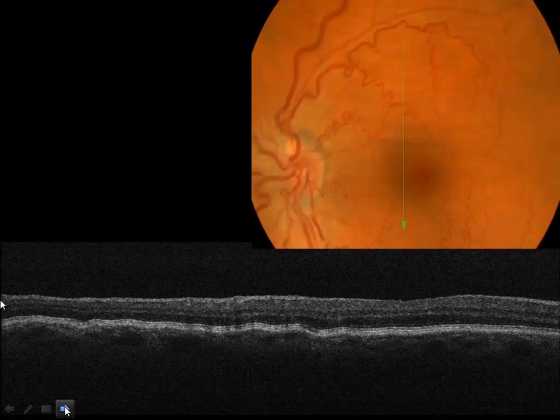And choroidal folds are problematic because choroidal folds may be due to a mass in the orbit that's compressing the globe, causing the choroid to be set into folds. Here's the left eye of the same patient. This patient actually has congenital disc anomaly with disc drusen in addition. And these are just very interesting discs with vessels, but it's all congenital. And I actually think that the horizontal choroidal folds are also congenital. Patient's mentally retarded and has a bunch of other problems.